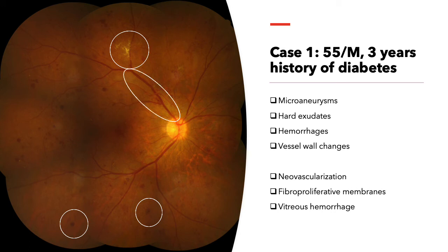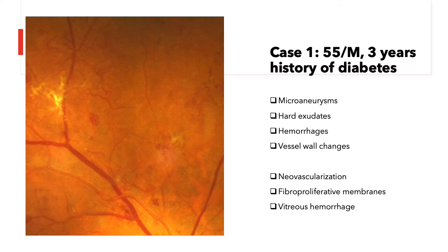And here, superiorly, the vein appears a little bit more dilated and a little bit tortuous. So let's look at the high magnification of that area there. There.